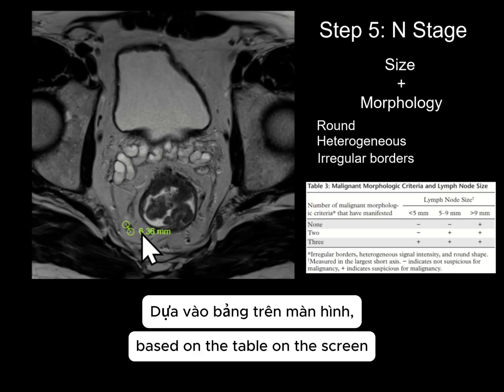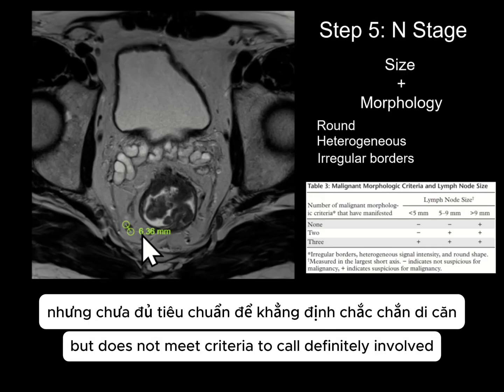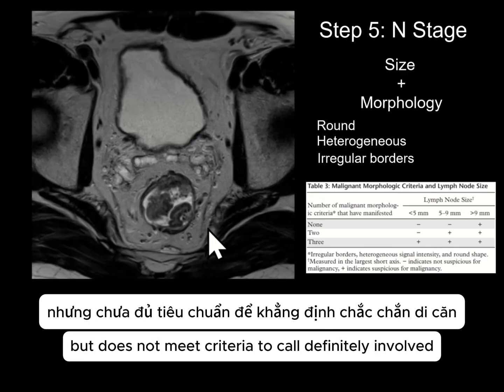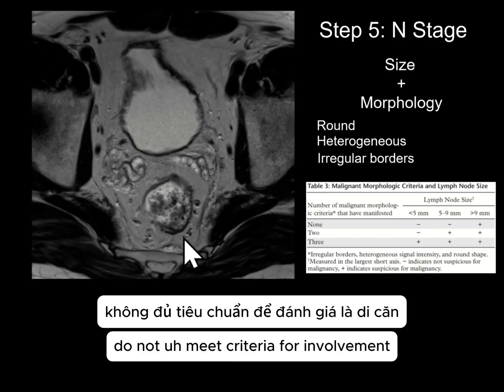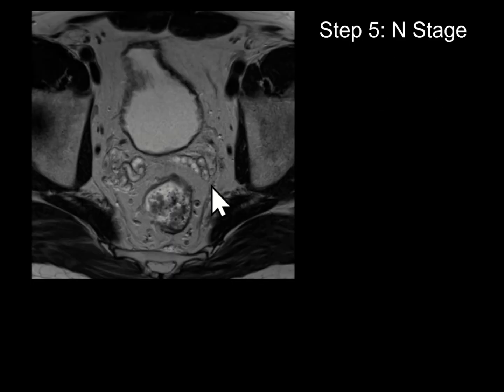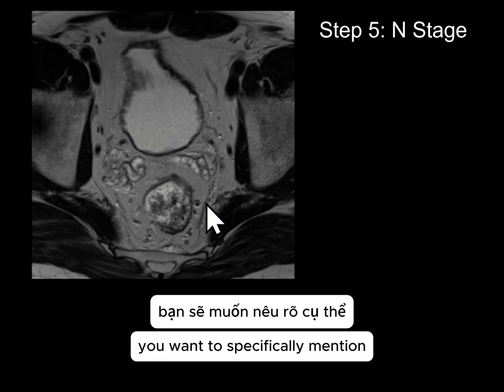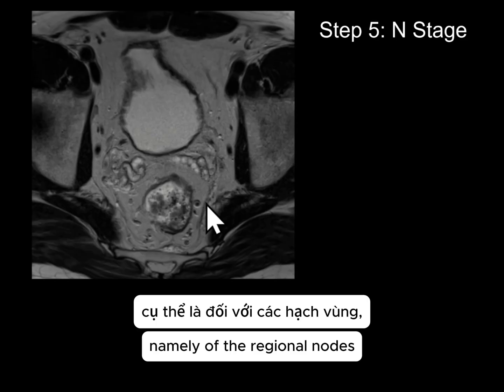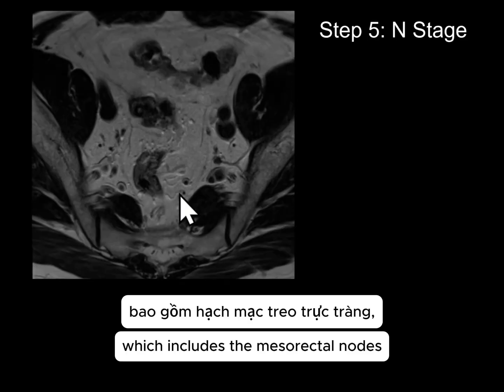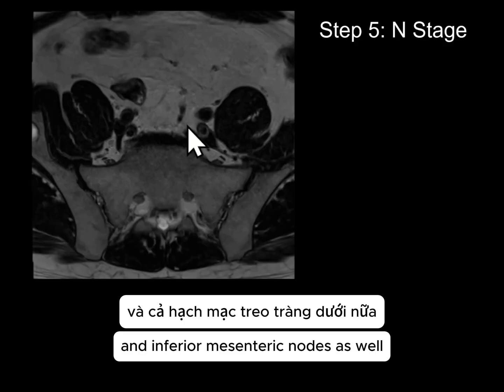Based on the table on the screen, this should be mentioned in the report as possibly involved, but does not meet criteria to call definitely involved. There are other small mesorectal nodes here as well that do not meet criteria for involvement. So if there was involvement of the nodes, you want to specifically mention which nodal stations are involved, namely of the regional nodes, which includes the mesorectal nodes, superior rectal, and inferior mesenteric nodes as well.